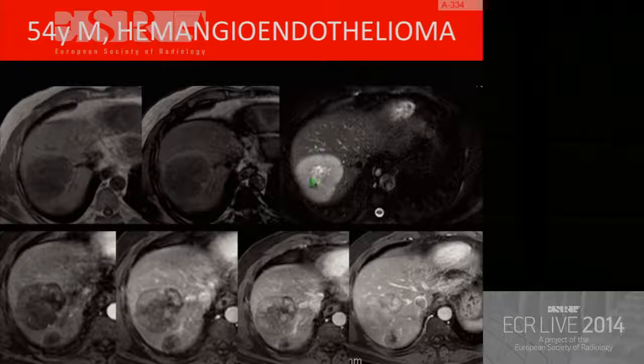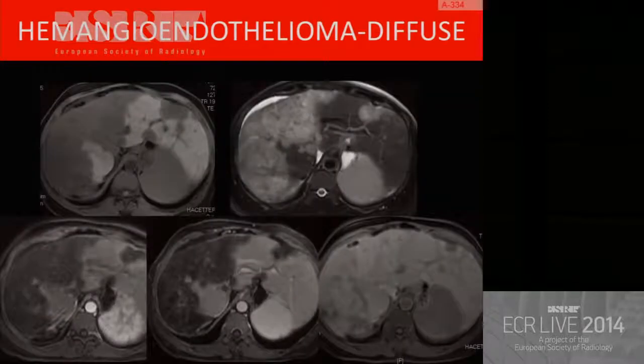So this was one of our patients. You can see T2 moderate to bright, but there's a scar. But look at the enhancement pattern. Peripheral enhancement, homogeneous, kind of filling towards the center, and it blends with the rest of the liver in the later phases.